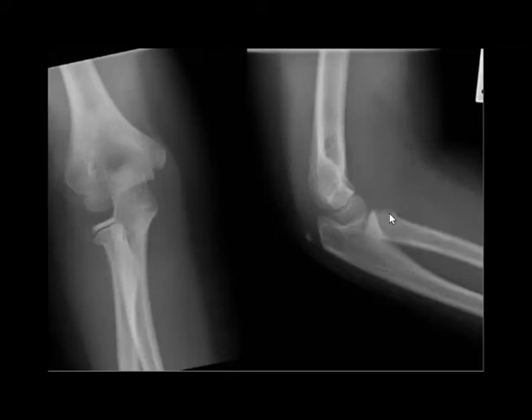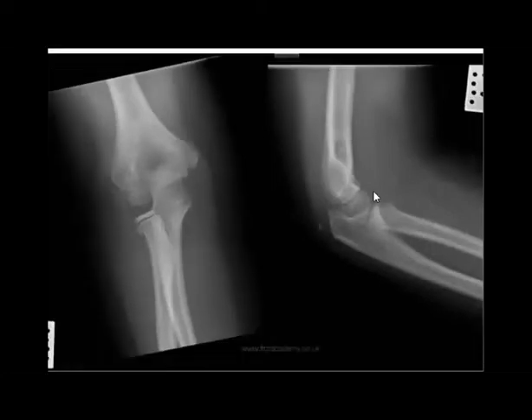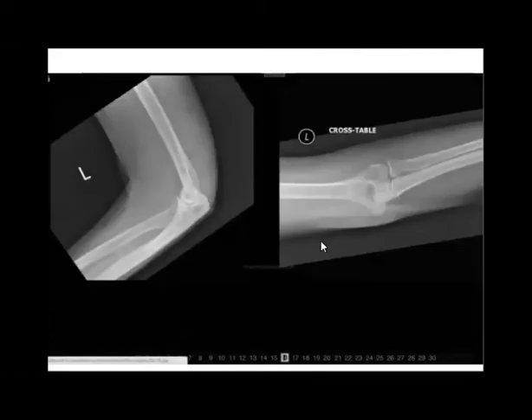So what do you think? Again, when you check in the pediatric age group, you will check the proximal radius or the distal radius. Welcome, Sarah. Perfect. Here in the proximal radius, at the neck exactly, you can see the fracture. It is easy. But to be honest, it is more than a greenstick fracture. It is a radial neck fracture, yes.